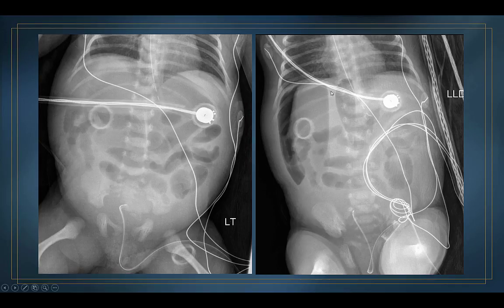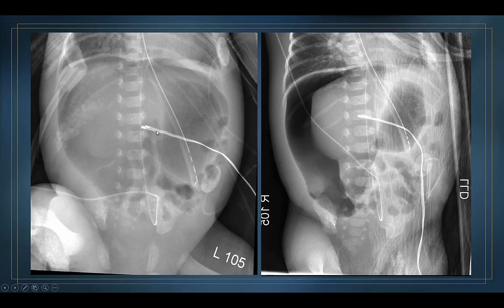Another example of the same thing. This is actually the falciform ligament with a fluid level sitting against it, and this is more of the pneumoperitoneum caught anteriorly in front of the liver, and it's demarcated by the falciform ligament. Okay, this is what I was discussing earlier.